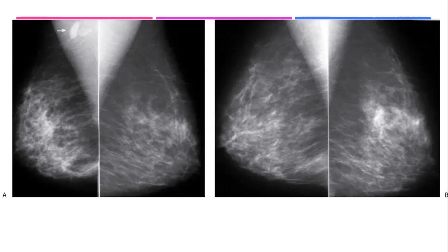So this is one of the pitfalls, not always being picked up, because usually we consider, especially if the contralateral breast is relatively dense, that the larger breast is the site of abnormality, not the smaller breast. But we have to consider that sometimes infiltrative malignancy can result in a shrinkage breast or shrunken breast.